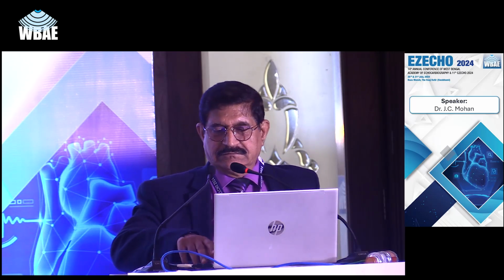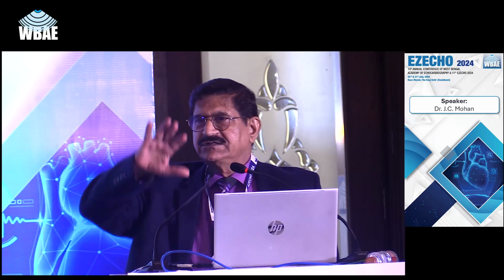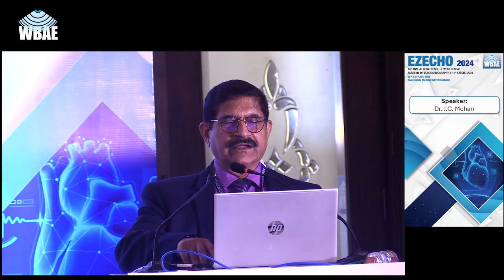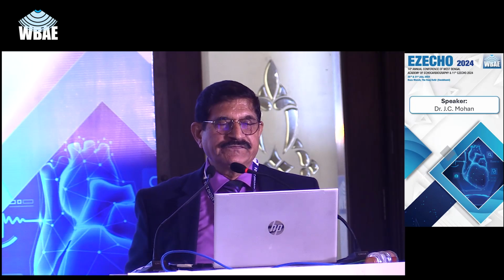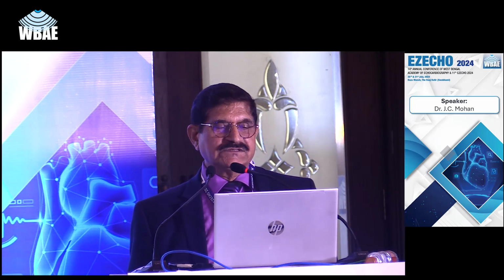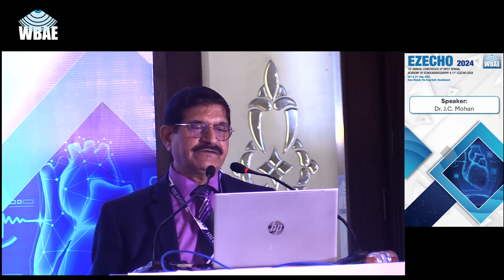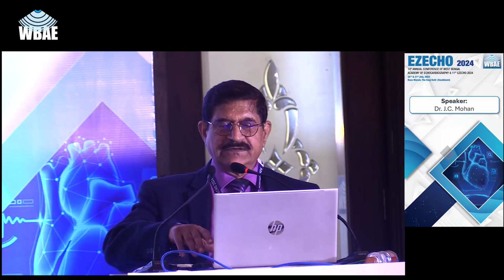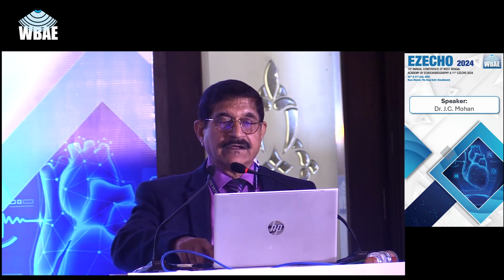So iso-intense signals in the whole of the myocardium. You would think that the whole myocardium is one stuff. But look further. Short axis view, you have of course hypertrophied papillary muscle, regional right ventricle hypertrophy, asymmetric septal hypertrophy, and of course some pericardial fat here and there.